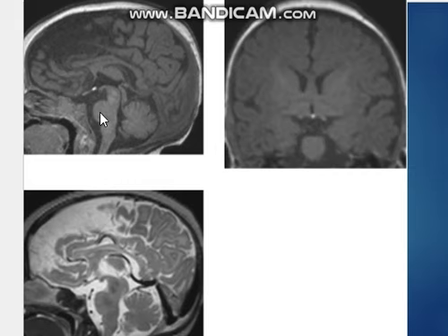Okay, because we are going to discuss another case of hypopituitarism, where the patient will complain of decreased anterior and posterior pituitary hormone levels and function. Why? Because the patient will have absent pituitary gland. Not in this case. This patient here has absent pituitary stalk. That's why the posterior pituitary is ectopic and the anterior pituitary is not connected to the hypothalamus. So the posterior pituitary is functioning. However, the anterior pituitary is not connected to the hypothalamus.